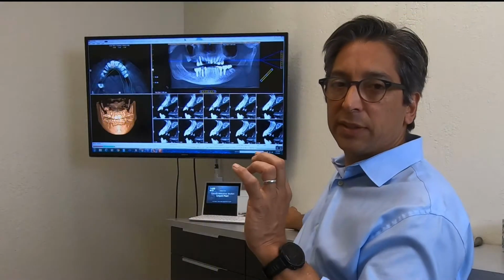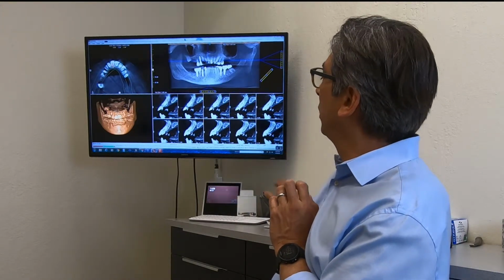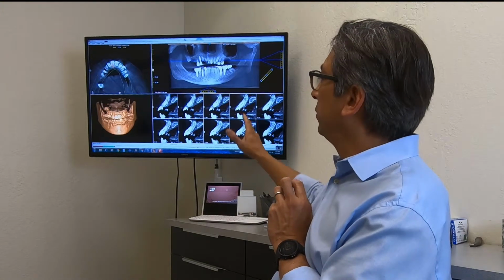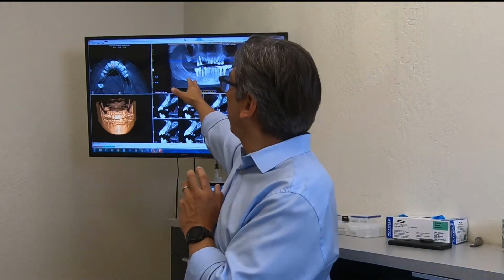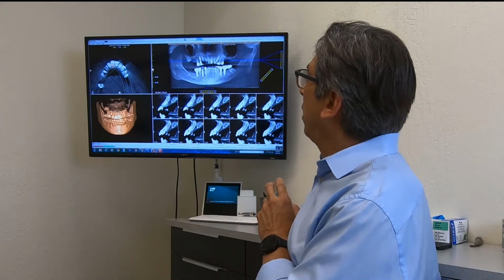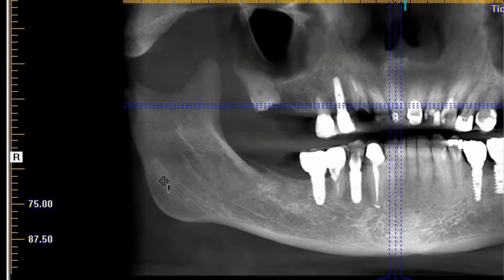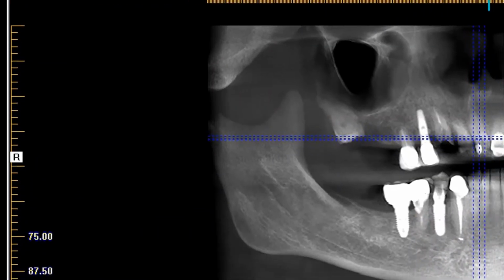One last tip on this section, and it's very important: each window section here is invisibly sliced into 3 sections. This far section over here, the right side of the patient, or your left side per window, whichever way you want to think about it, has an icon like this. It's this little crosshair thing. That allows you to grab on it and move it any which way you want around the screen. So that's what that means.